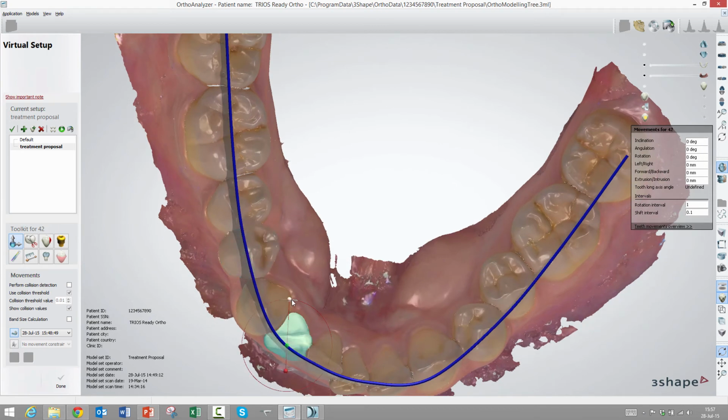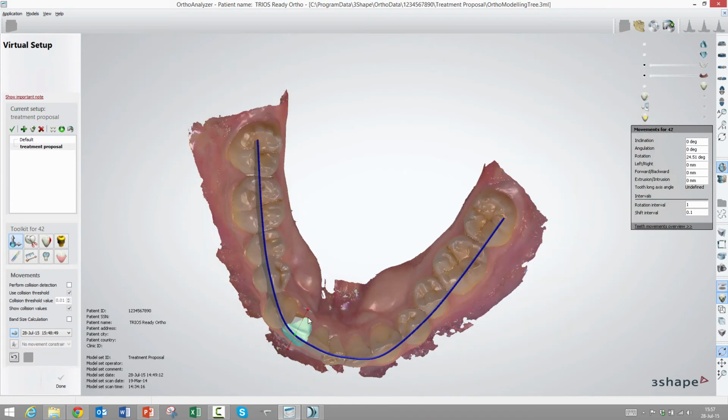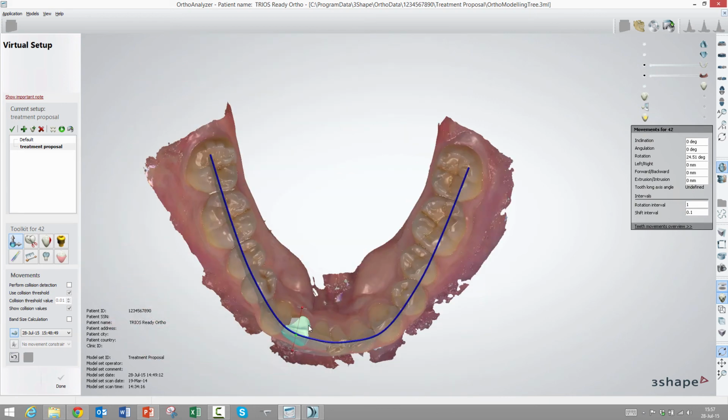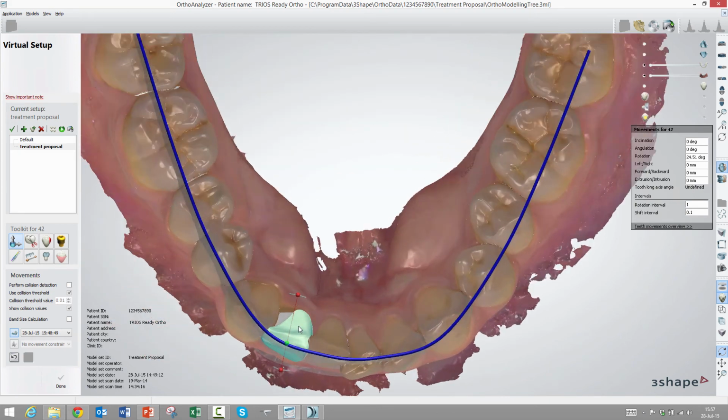And this is really the exercise here for this patient, I guess: we need some space. I mean, we have probably a little too much to fit into the lower jaw, at least. So what I'm doing here is trying to fit the teeth.